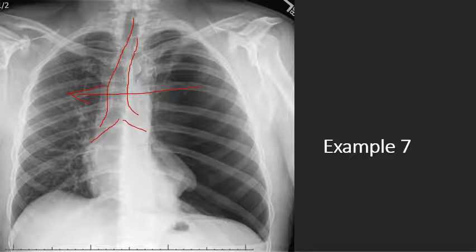And then our bones and our lung fields. So we go down over here and we don't see any gross changes. The hilum and the lung markings are pretty congested. But when we go over here, I see no lung fields. It looks like a beautiful x-ray where I can see these bones. This is perfect. Well, that's not normal. And if you see the lung markings right here, that is a bad day. This patient has complete deflation of the left lung, both superior and inferior lobes. It is a bad day.